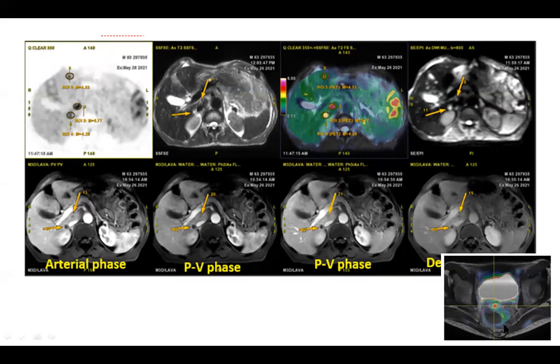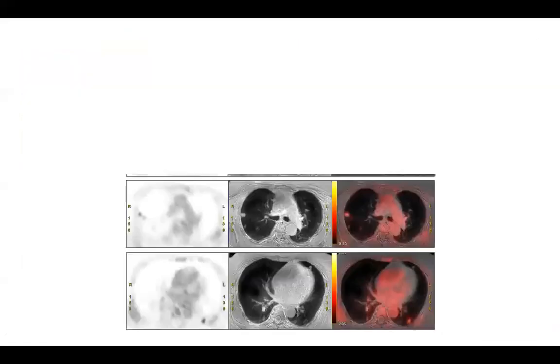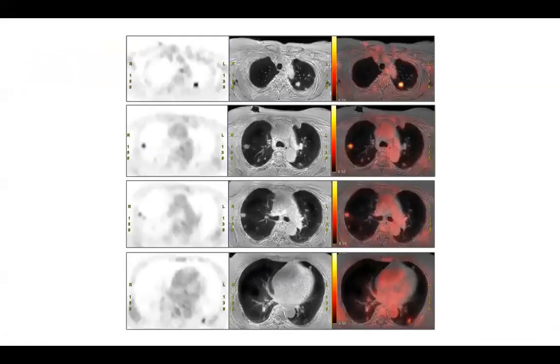There was also peritoneal involvement in this case, peritoneal nodules. This is the largest nodule which we encountered, insinuating between the urinary bladder and the rectum. The patient also showed metastatic involvement of the lungs.